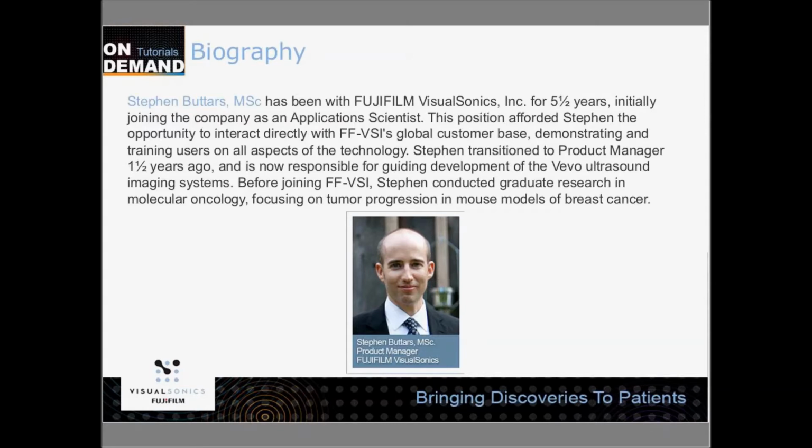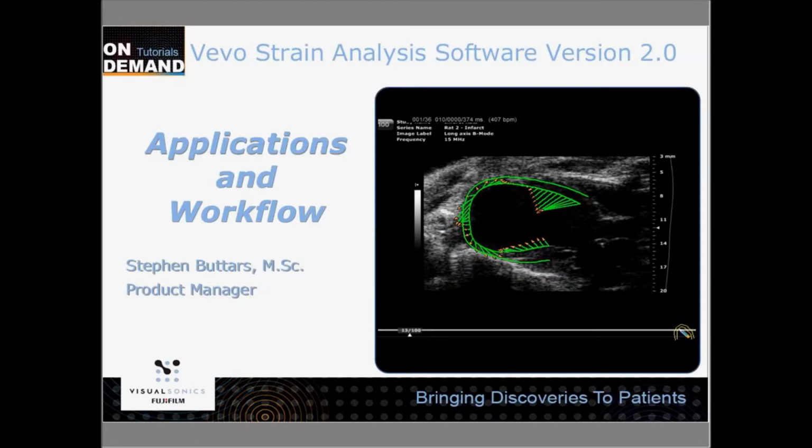Great. Thanks so much, Meena, and thanks everybody for taking the time to join us on this tutorial. For the tutorial, we're going to talk about a couple of different things, mainly focusing on the use of the VevoStrain analysis software. We're very happy to debut an updated version of the VevoStrain software, what we've been referring to as VevoStrain 2.0. The software was updated back in the fall based on a lot of feedback, information, and ideas that were sent to us from customers over the years. And we've tried to integrate a lot of the changes and suggestions into the software.